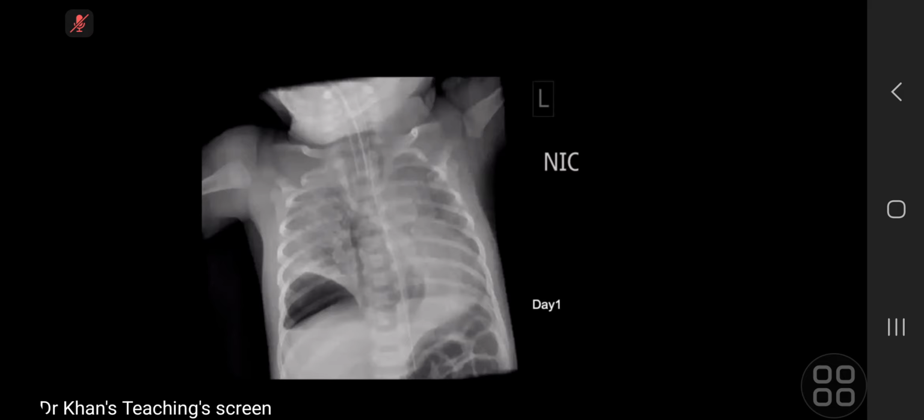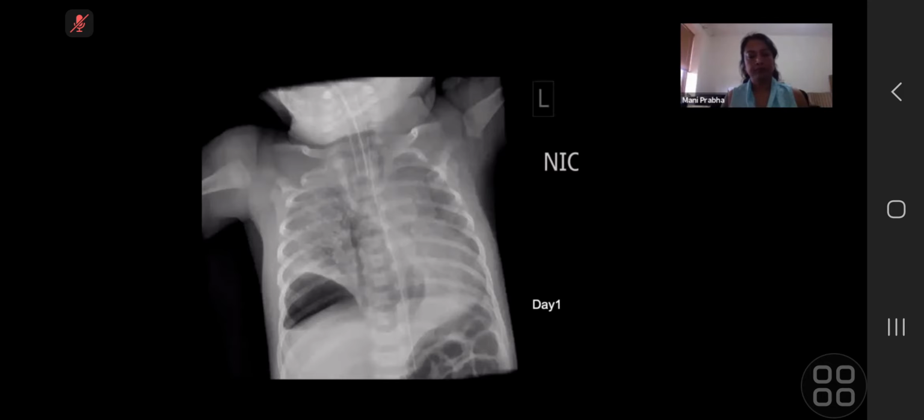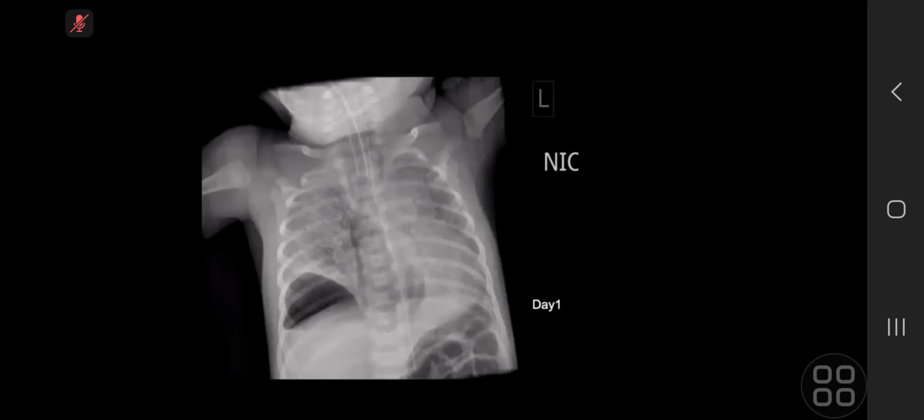In the day one preterm child, if the child's been on ventilation, again, it will be pulmonary interstitial emphysema, will be my differentials, as well as, I think he'll be too young for bronchopulmonary dysplasia. The other potential being meconium aspiration.